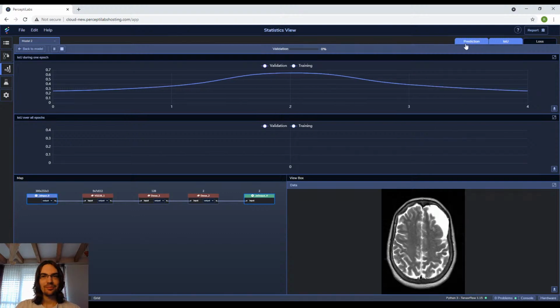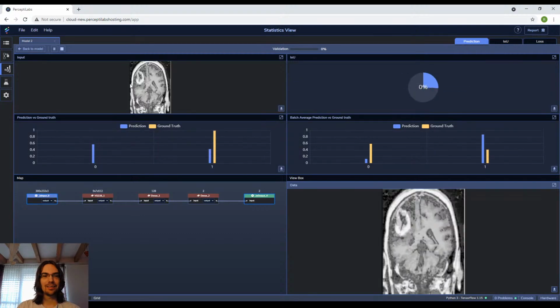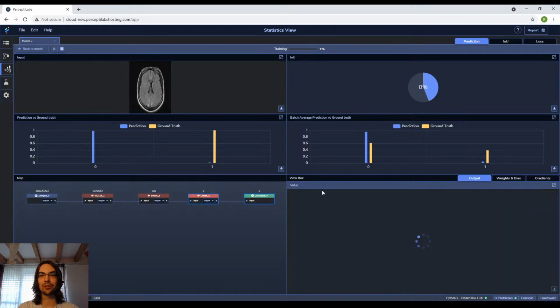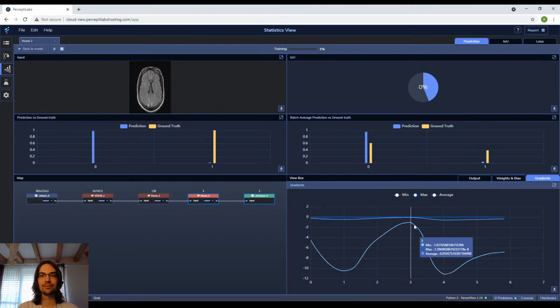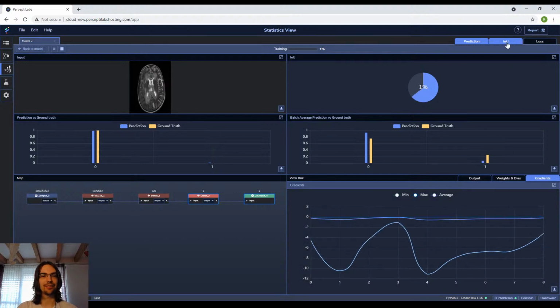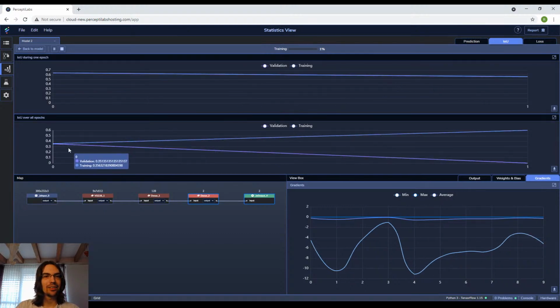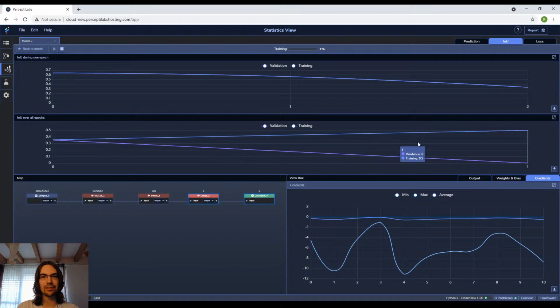So, as we were saying before, since we fairly easily could see the difference between someone having a tumor and not when comparing the images side by side, I wouldn't be surprised if the model also managed to do that pretty well. We can see that the gradients are changing, which means that everything is updating as it should. And we're starting at this time at 35% accuracy instead, but fairly quickly going up, it seems.